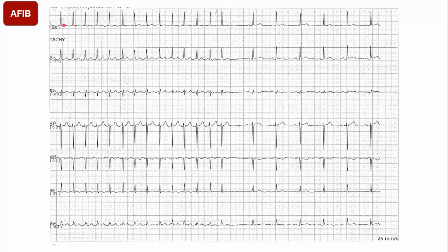So in other words, this is atrial fibrillation, and then it takes over and goes back into sinus rhythm. This is what this EKG is showing. Atrial fibrillation rhythm here, and then it goes back into sinus rhythm. This one is pretty tricky because you really have to march out these QRSs to prove to yourself that it's irregularly irregular.